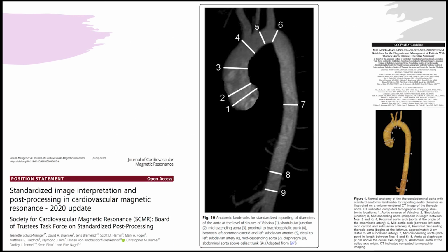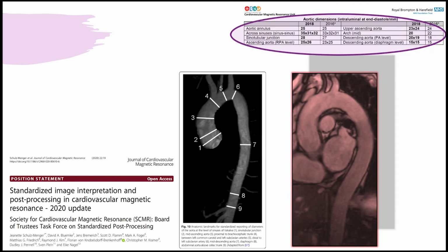You will now have available to you the quantitative and qualitative findings for case 8. In terms of reporting on the aorta, including a table comparing up-to-date aortic measurements and previously available data is extremely helpful in your report.